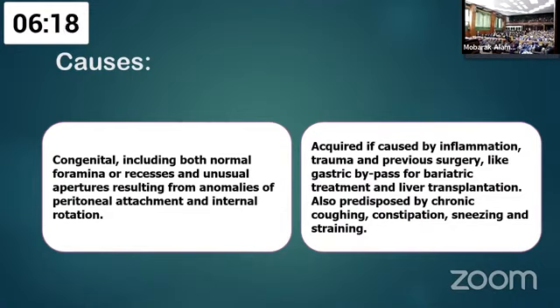Small internal hernia can present with small bowel obstruction, in which an unlucky bowel segment is trapped within the hernial sac, causing U- or C-shaped dilatation of the bowel, obstructed at two adjacent edges. One edge is called the oral edge, and the other is called the anal edge.